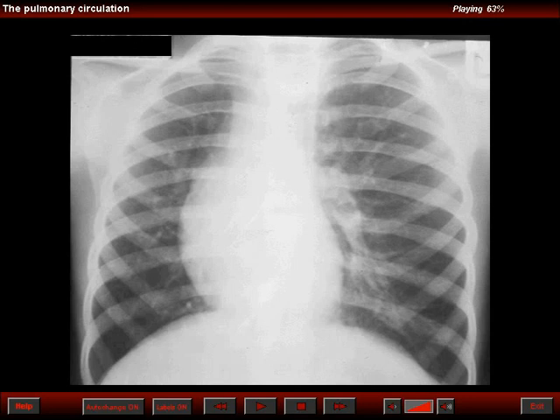of the tracheobronchial tree. So a better term is the hypogenetic lung syndrome, and Dr. Felson used to call it the venolobar syndrome. There's more than veins and more than the lobe that is abnormal. So here is a frontal view of the chest that shows a dextrocardia with dextral rotation of the heart. Note that the right lung is somewhat oligemic.